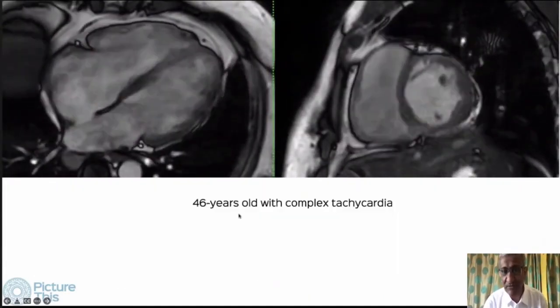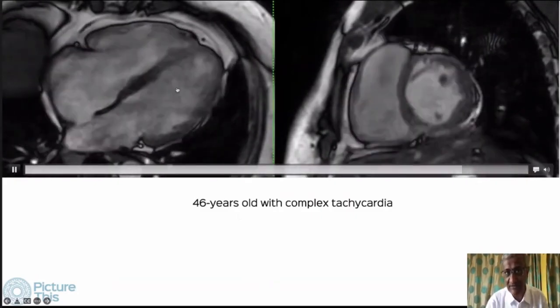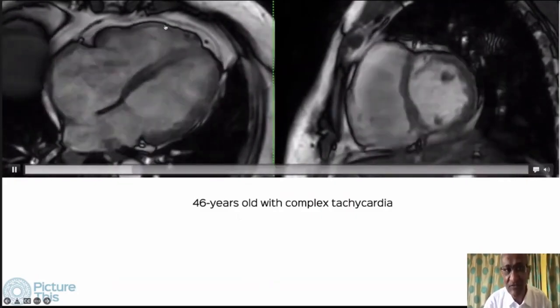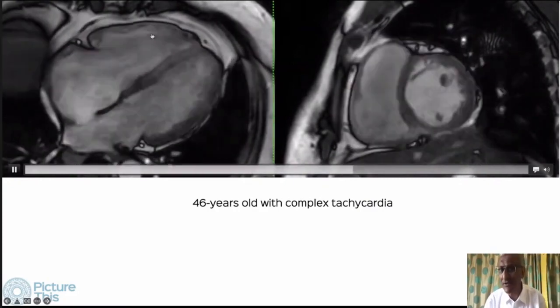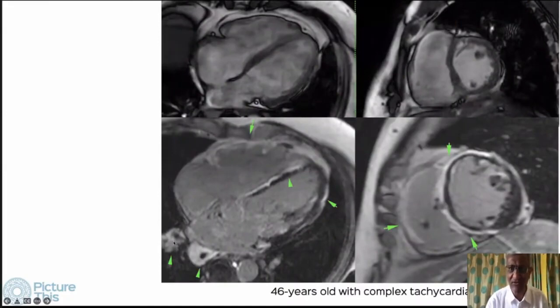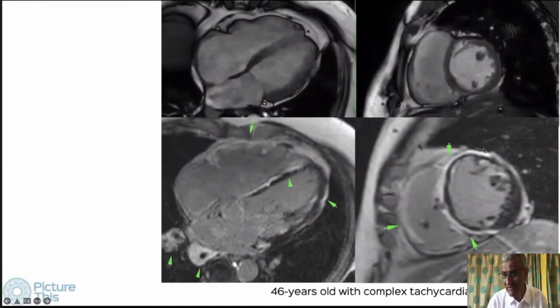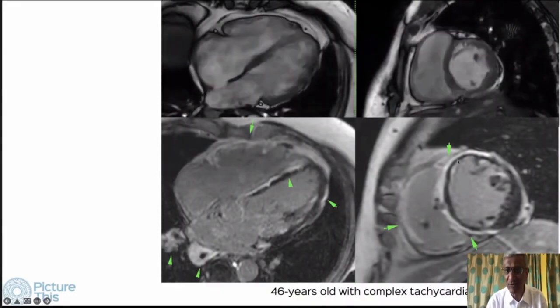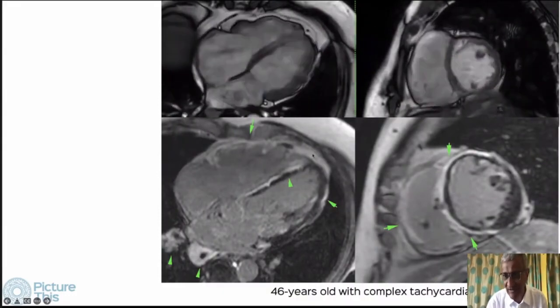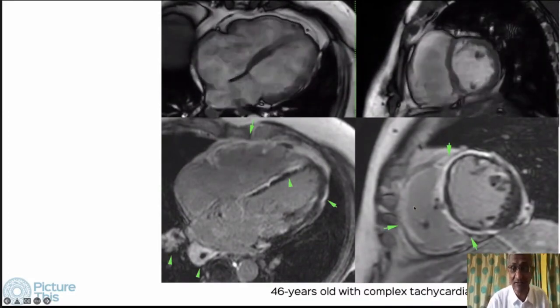The second patient, a 46-year-old with a complex tachycardia, has biventricular disease. Now, if you see that the RV is abnormal, but doesn't show any pseudosacculation, aneurysms, etc., and the late gad shows abnormal mid-myocardial epicardial enhancement, both of the LV and of the RV, you could turn around and say, can't this be ARVC with ALVC?